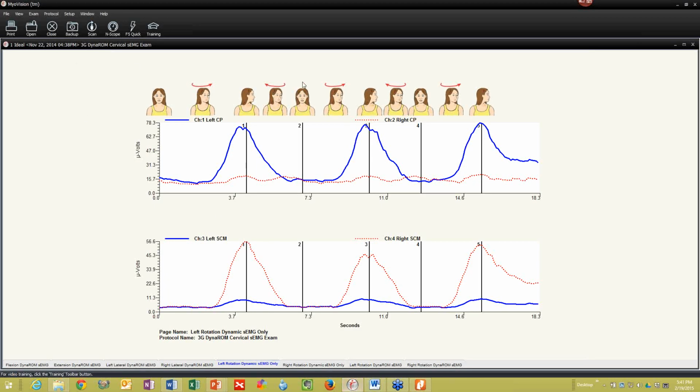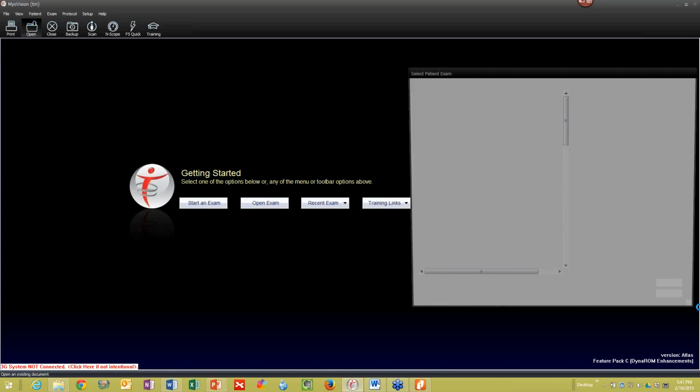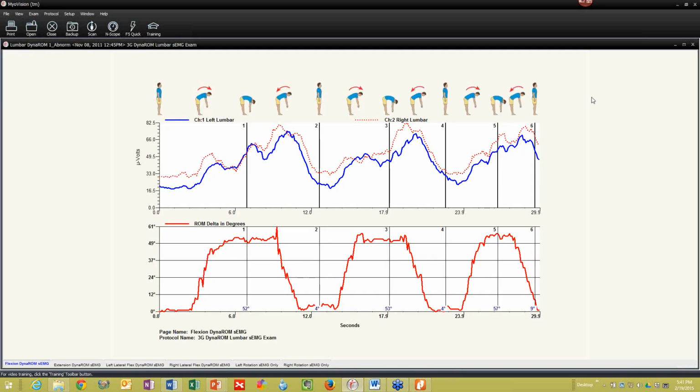So if we go in here, showing you how the ideal works too, let me do this quickly. If you want to show a patient next to an ideal, let's say we open, we're going to close this, we open a test. I'll pull up an abnormal lumbar test. So we pull this up, we have this up on the screen.